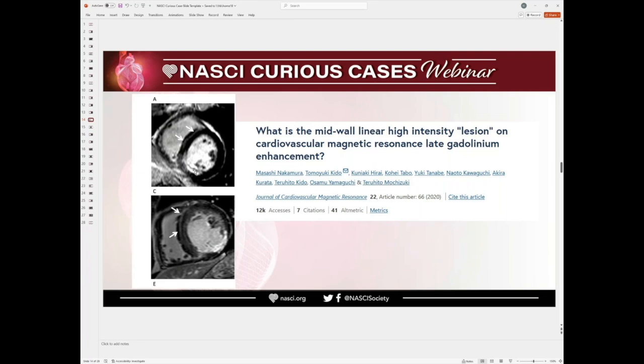Let's say the patient has dilated cardiomyopathy, then I can, but I have to be very convinced that it is real. So I don't know what your experience is with this basal interventricular mid-myocardial stripe. Do you call them all whenever you see it, or does it just depend on the clinical indication?